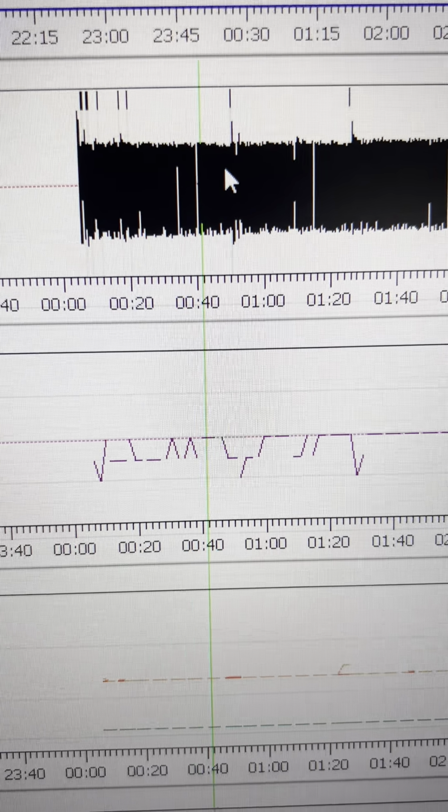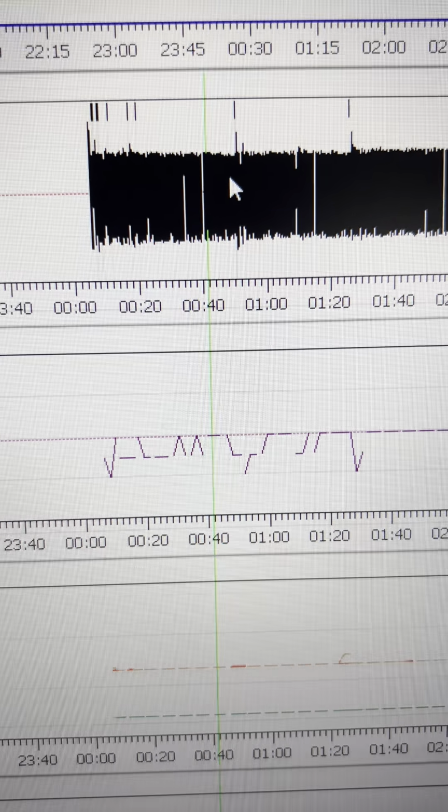If I zoom out, here you can see it's down. If I go more to a part right here, you're probably gonna see it's more of a seesaw pattern. Right here, see? More of a seesaw. Sometimes there's one breath like this, but they're all seesaw.